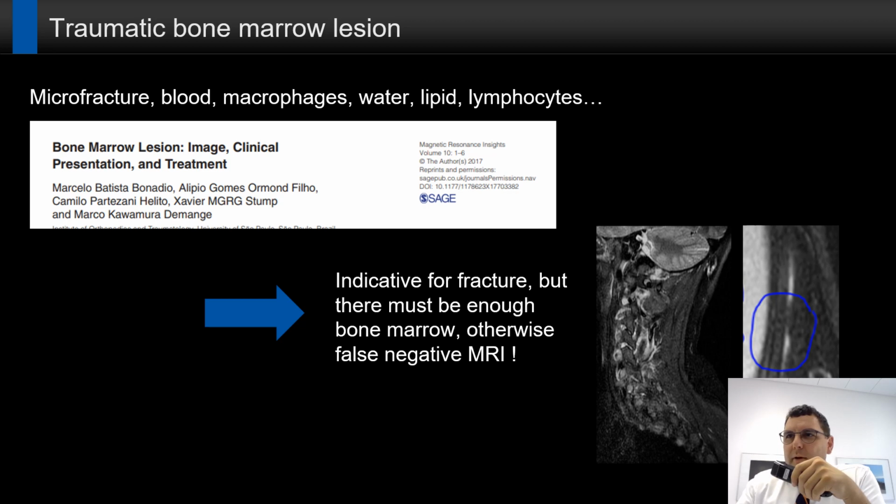The same is usually for the cervical spine, where you don't see a lot of bone marrow edema because the bone is so dense, and it's known that you can miss fractures on MRI in the cervical spine. In the past, I always recommended additional CT in spine injury, and well, after my Formula 1 race driver, I don't know what I should recommend in rib fractures if you don't see them. But anyway, I wanted to bring you this case to show you that this is not so easy sometimes to detect.